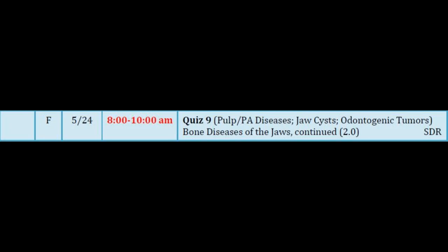And if we wait for jaw lesions to have a sunburst pattern, like this one, that patient's going to die. There is really no hope of curing a patient that has an osteosarcoma that is so big to have a sunburst pattern like this. This is a very advanced disease. Patient probably already has metastasis to the lungs by the time it gets like this. So osteosarcoma of the jaws, we don't look for the sunburst pattern.